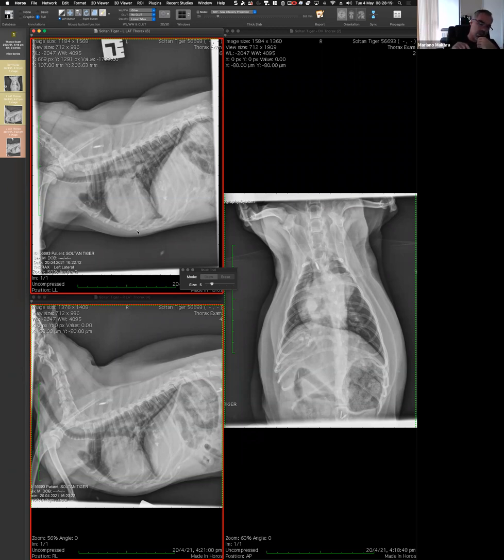And one thing that I would add is that there is no fluid. Makes sense because now you are describing that border, and that means that there's good detail. And I think that's probably even the most important finding here.